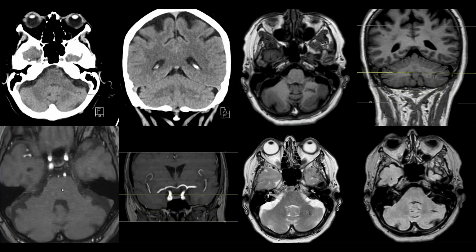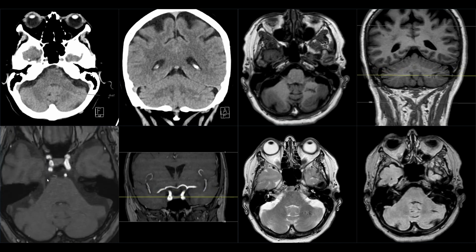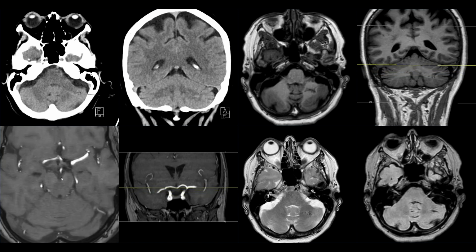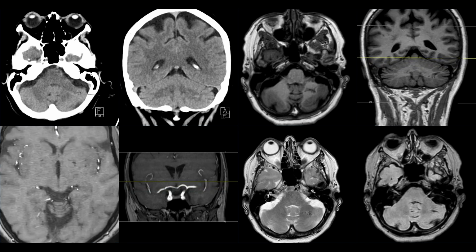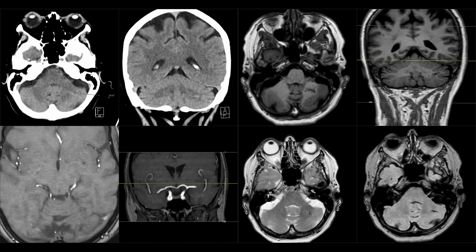The other anatomical variant that we see quite often is that you can see the posterior communicating artery is feeding directly the right posterior cerebral artery, with the P1 segment that should be between the basilaris and the posterior cerebral artery absent. On the other side, on the left, you can see P1 and then it continues to the posterior cerebral artery just like normal. And here the anterior communicating artery.